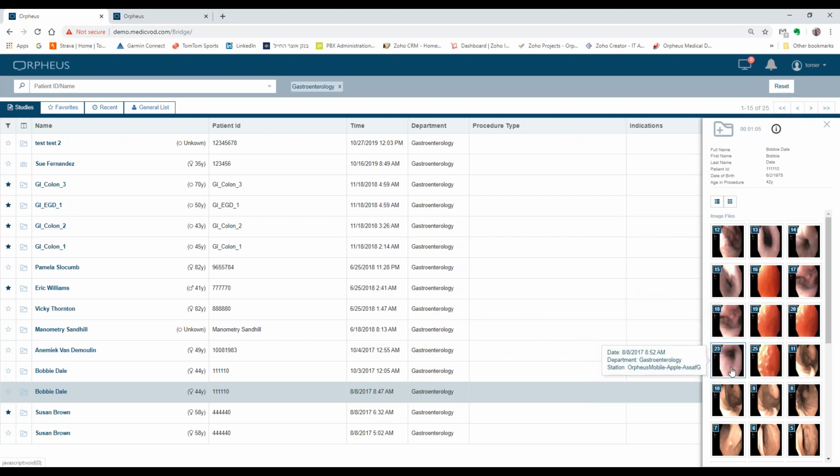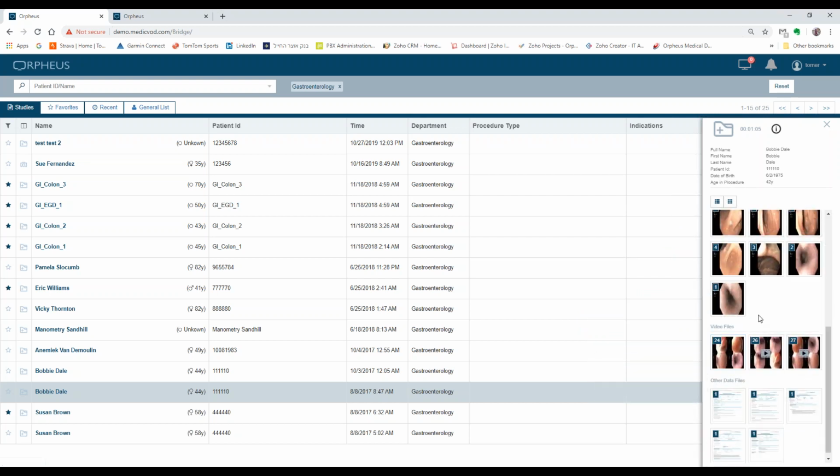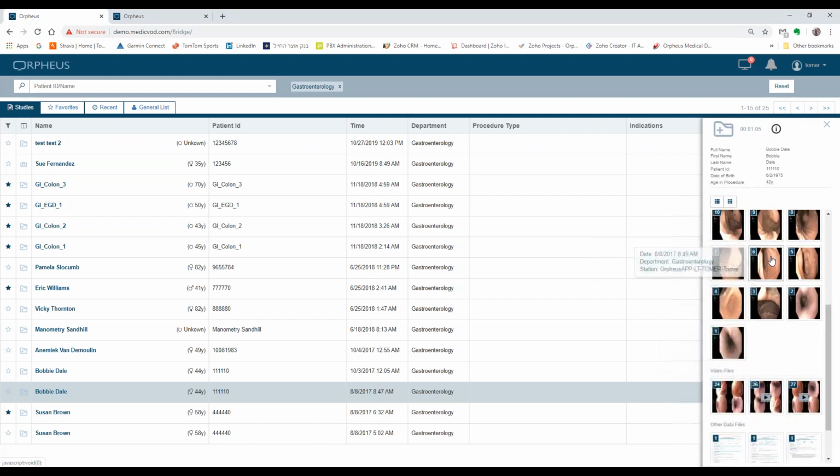So I remember last week we had a question regarding auditing. If a video has been created, like edited, or an additional image has been created, you will see that it will show the application here. You can see Station Orpheus Web and the username that created this specific video. This is already part of that auditing capability to track additional content that may have been created on the system.